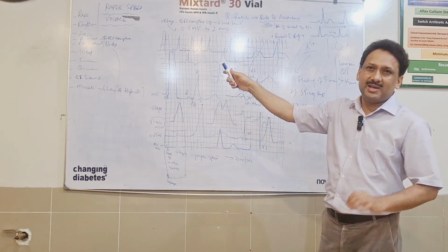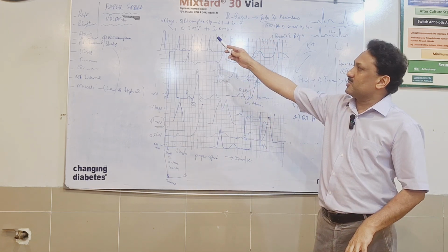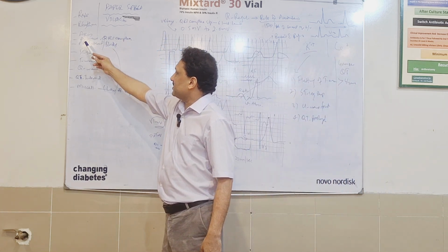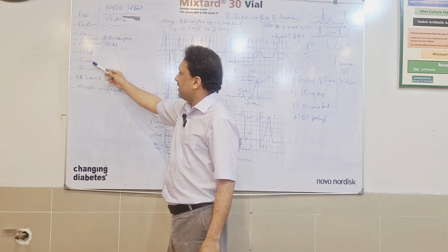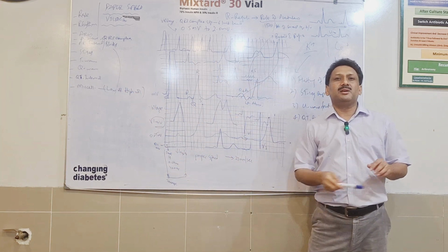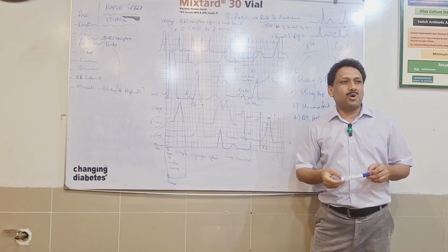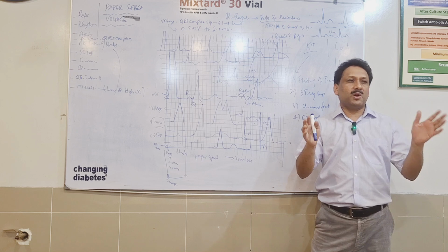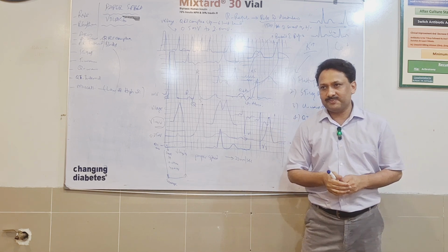So just summarizing, whenever you are looking at ECG, always focus on paper speed first, then voltage, rate, rhythm, axis, P waves, QRS complex, PR interval, blocks, ST segment, T wave, Q wave, QT interval, and then in the miscellaneous setting, you can find different other things as well. So this is all about the ECG, the basic principles, whatever at your level you wanted to know, this is sufficient. Thank you very much.